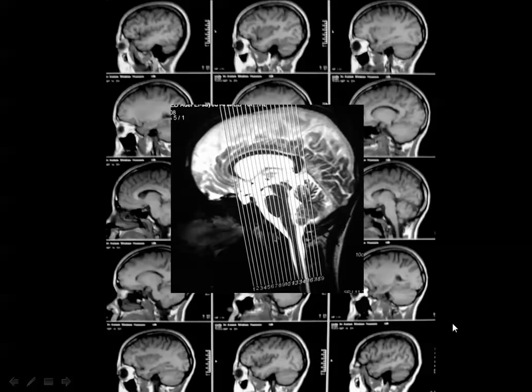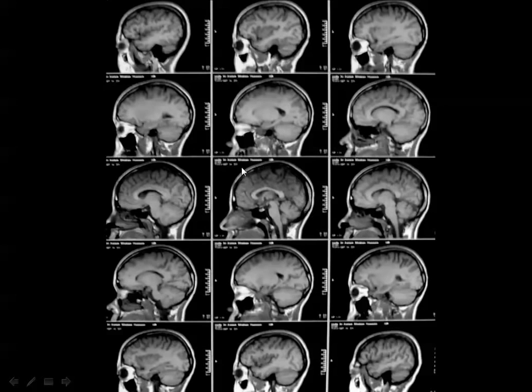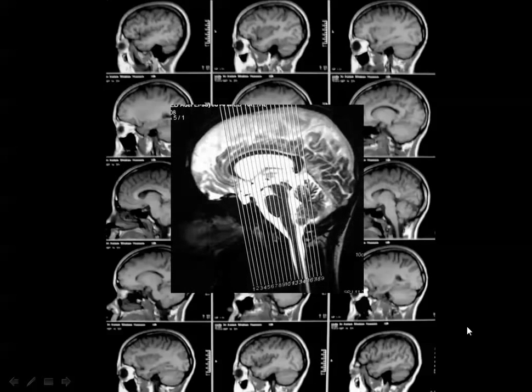But this is not the case in every patient, and you may have this midline image containing brain tissue, and you can, by reading the data on the image, know whether this image is relatively to the left or to the right side of the patient.